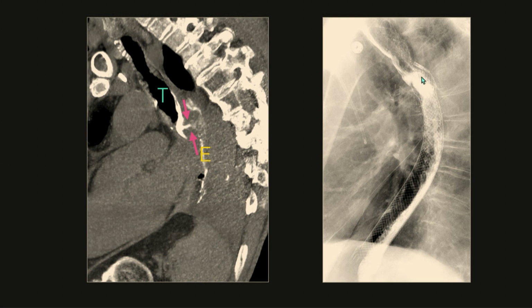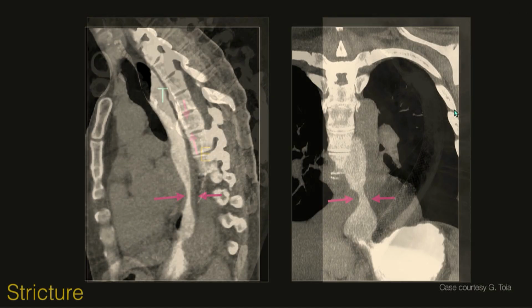And this patient was treated with a long segment stent and was able to heal up. So this is helpful for guiding management and also provided a lot of exquisite anatomic detail that I think would be a bit of a mess in the fluoroscopy suite.